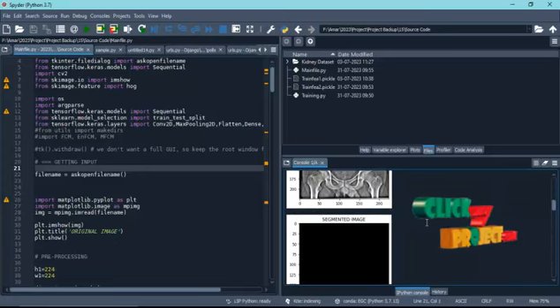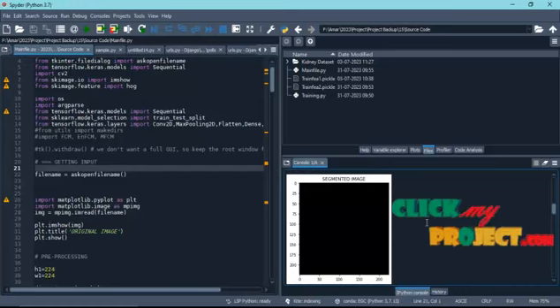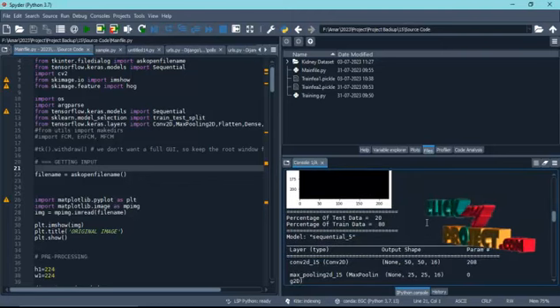After the grayscale conversion, the segmentation is carried out. In this segmentation, the pixels will be segmented. In case a large amount of kidney stone is present, it will be visibly seen, or else it will not be shown.